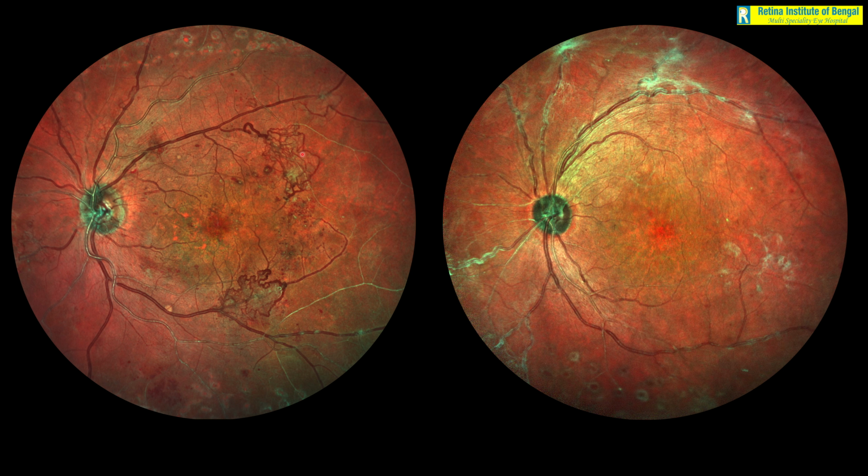Next comes proliferative diabetic retinopathy. So I've already told you that in DME, where you are monitoring macular edema, multicolor imaging is very useful. I have personally found it to be extremely useful in proliferative diabetic retinopathy. So why is that? In proliferative diabetic retinopathy, the main highlight is the presence of new vessels, neovascularization. Now in multicolor imaging, you can very easily make out the new vessels. First of all, it will help you diagnose each and every new vessel because it is a high contrast image.